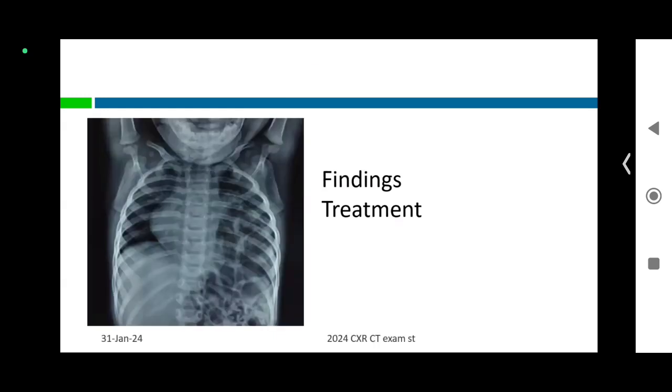What is this? Anyone wants to answer? Yes, Deepana? Tell me. The same CDH only, sir. Same CDH. But there is no mediastinal shift, sir. Okay. Here, Akhilesh, eventration of the diaphragm. Again Gomati says this is eventration. This is eventration. Why? Because you are able to see the diaphragm.